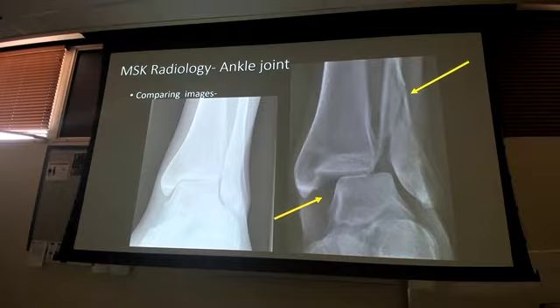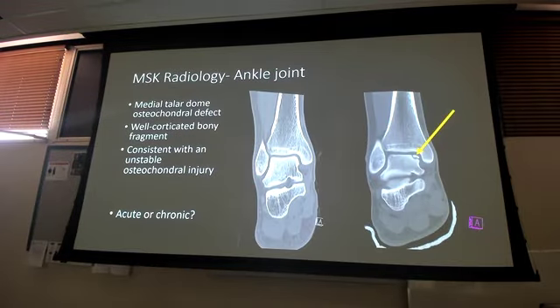So again, if I were to see something like this, even though my fibula is fractured, I'm still gonna get the top part too, just to make sure. But the issue with this here is I have my answer. I have an unstable ankle. I have an unstable lower leg. Because you can do this, and if the fibula is still intact, they're still stabilized, right? They have that man-made splint in the fibula, kind of holding things where it needs to go. But when you have fractures in both, this is unstable, they should be non-weight bearing. Okay.